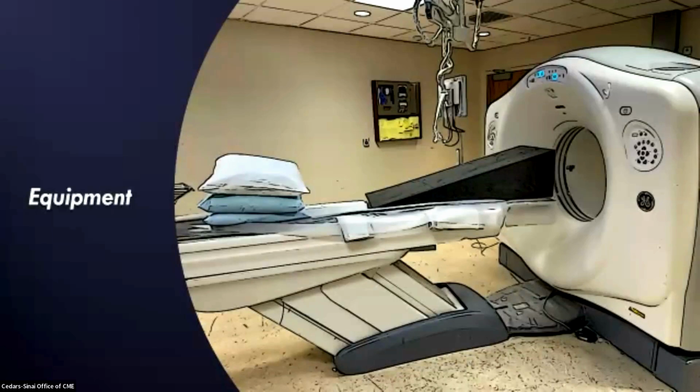Here's the equipment that you need, which is a CT scanner, of course, and that's the most expensive bit. Then you need something to elevate the patient so that when you inject contrast, it will run with gravity downhill, because I can tell you CT scanners don't tilt very easily, and your engineering department will get very upset at you if you try to tilt them.